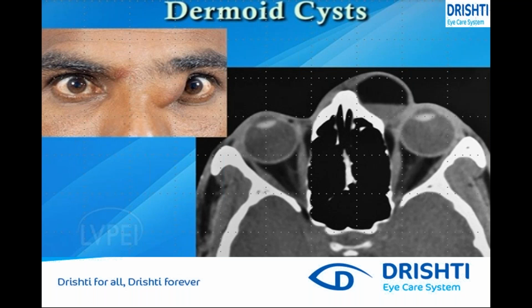This is a very vast topic. There are multiple cases, and many more things have to be taken care of while interpreting CT scan orbit reports. So this was the simpler form.